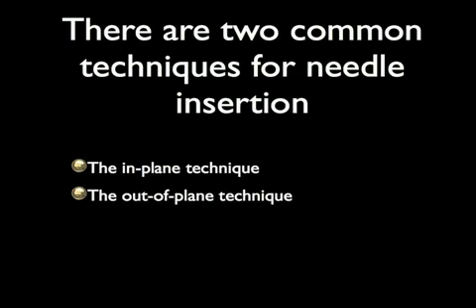There are two common techniques for needle insertion. These are 1, the in-plane technique, and 2, the out-of-plane technique. Each has its own advantages and disadvantages.